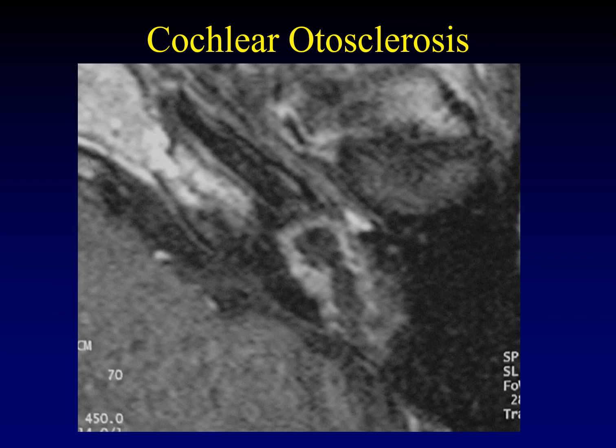You can see otosclerosis on MRI, although CT is the preferred way to image it. It appears as circumferential inflammation enhancement around the entire otic capsule.